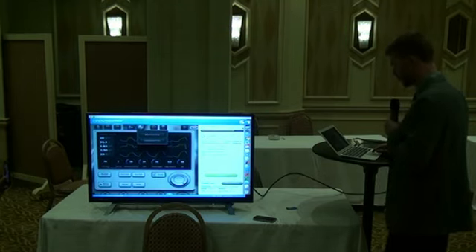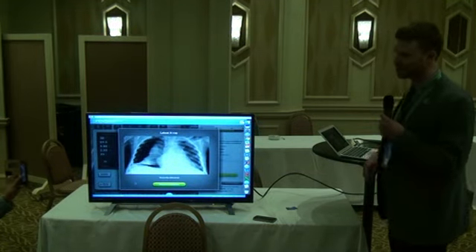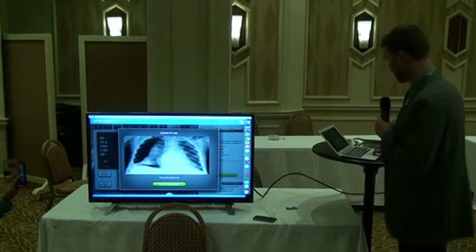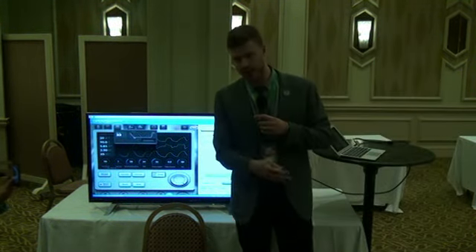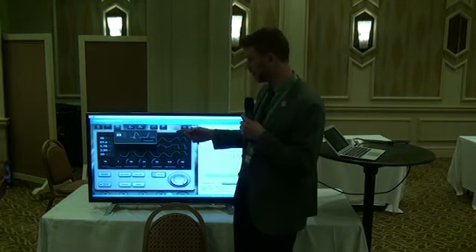Our radiologists are real quick. They come back in like 5 seconds. All right, so that's not good. It's like a whopping pneumothorax, right? So when we were looking at the end-tidal CO2 tracing, what we were seeing was that some of that breath wasn't going back through the sensor, and it was going somewhere else, and it was accumulating in the pleural space.